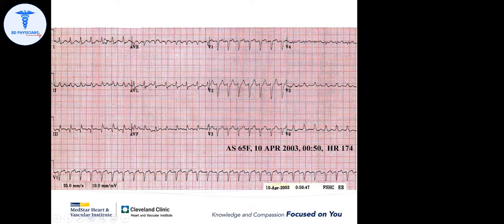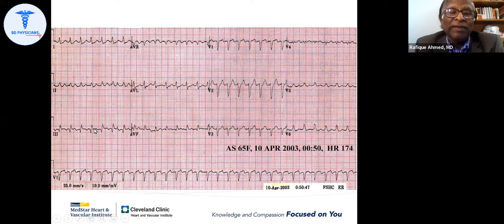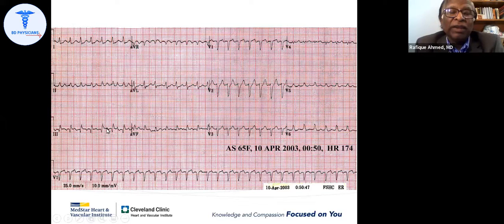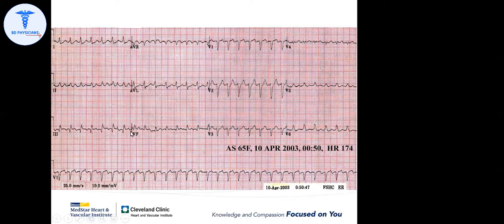So you are thinking this is a P wave, but if I say this is the end of the T wave, how will you justify that? So it's a possibility, right? That this is the end of the T wave. How about lead 3? Maybe a P wave, right? The P wave seems to be inverted in lead 3, right? How about lead AVF? Maybe inverted, right?